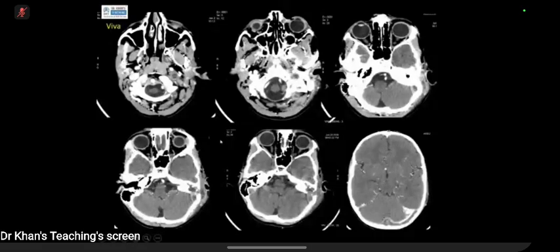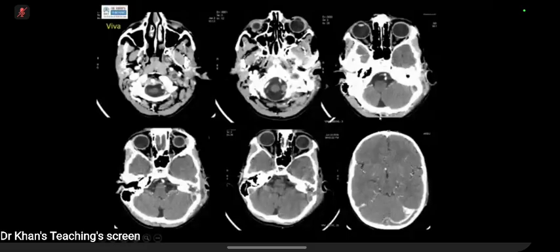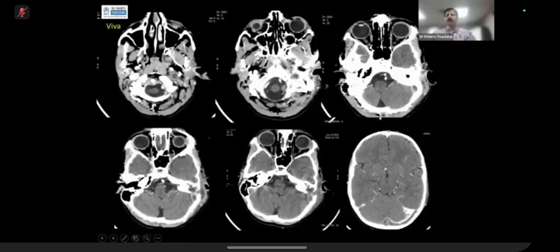Looking externally as well, there appears to be some enhancing soft tissue external to the region, seen at the upper right image. I'm not sure what that could be, but the filling defect could represent thrombus, and the external finding could be due to an infection.